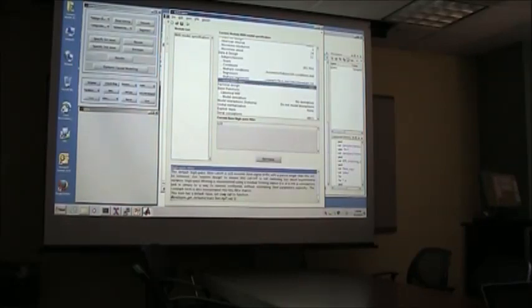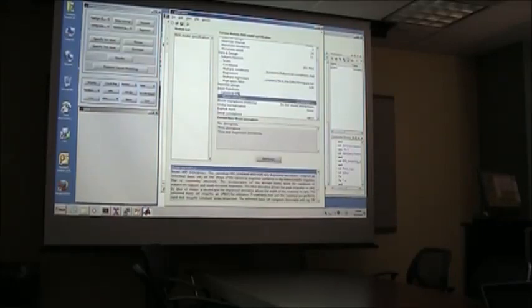Right, yeah. So let's actually just run this thing. For now, this is a little different than in the manual. I'm just going to use the standard model of the HRF. SPM also allows you to incorporate the possibility that the timing of your HRF is a little different across subjects. You can read more about it in the manual if you're interested, but for now I'm going to keep it as simple as possible. So let's run this model.